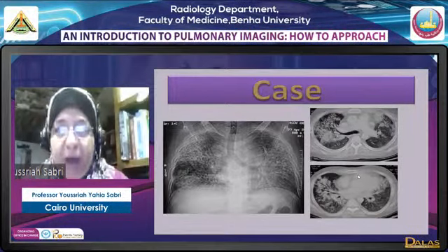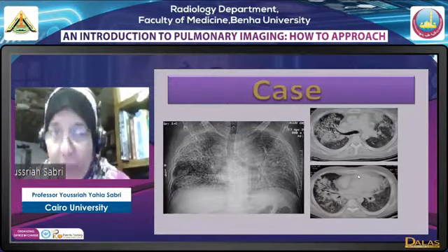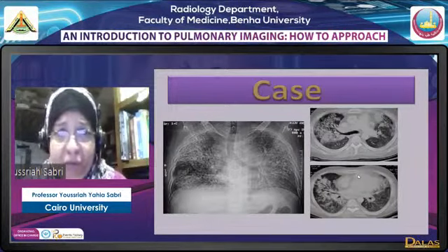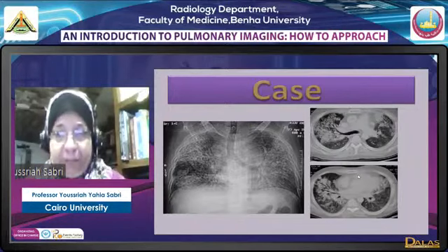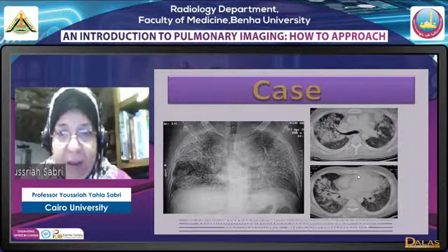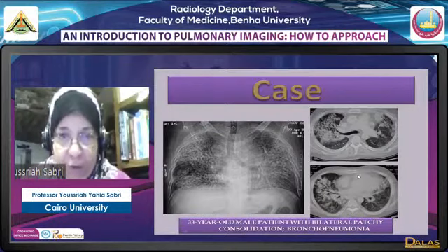Here we must be guided by history. The commonest cause actually is a bronchopneumonia, but hemorrhage may have such an appearance, atypical patterns of edema, atypical pattern of eosinophilia. Some tumors may be presenting with this same pattern. It has a very wide differential diagnosis, okay? So the commonest is a bronchopneumonia. This was a case of 33-year-old male patient with bronchopneumonia, patchy and bilateral.